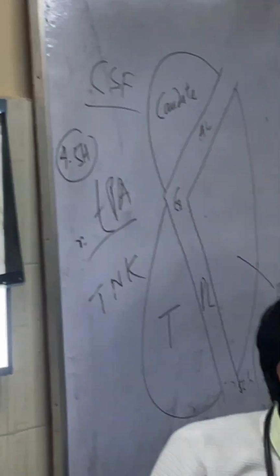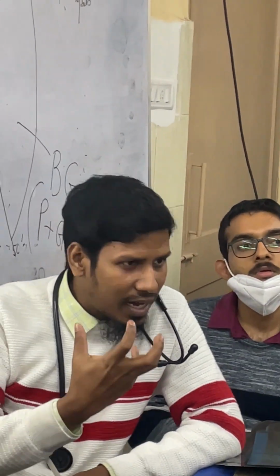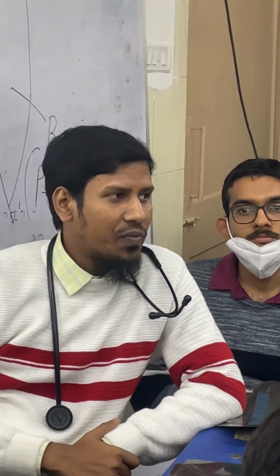So what interpretation will we do from the bones, that is the ribs? If there is rib crowding, that means again there is a pulling lesion, that means collapse or fibrosis or might be malignancy.